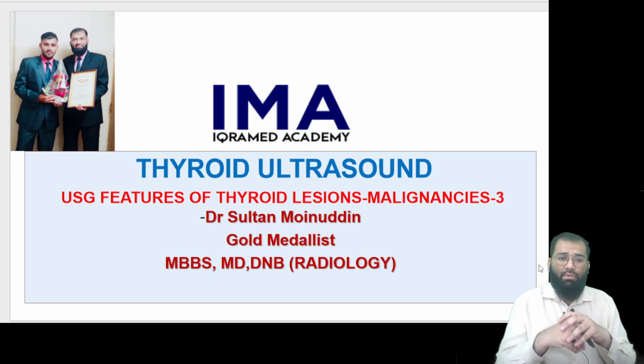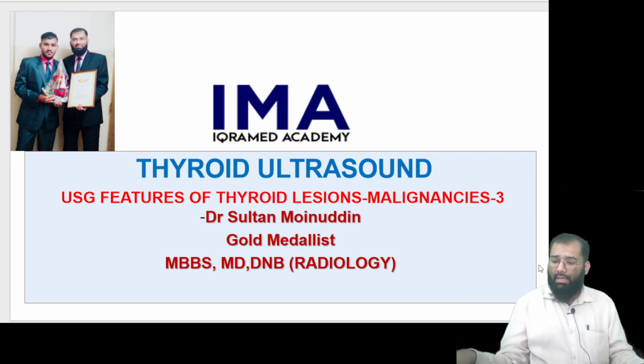Today we are going to start the third session of ultrasound features of malignant thyroid lesions. Okay? So without any delay, we'll begin it. A brief overview of how we are going to go about in this session.